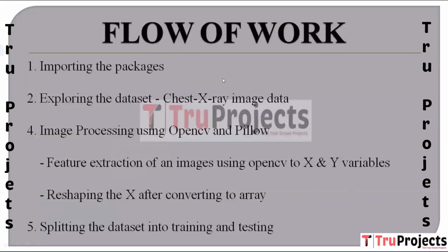So now coming to the flow of work, here first we have importing the packages. This involves bringing in various libraries and tools necessary for the task ahead, such as data manipulation, machine learning and image processing. Common packages might include NumPy, Pandas, OpenCV, PIL, Scikit-learn, Keras and others.